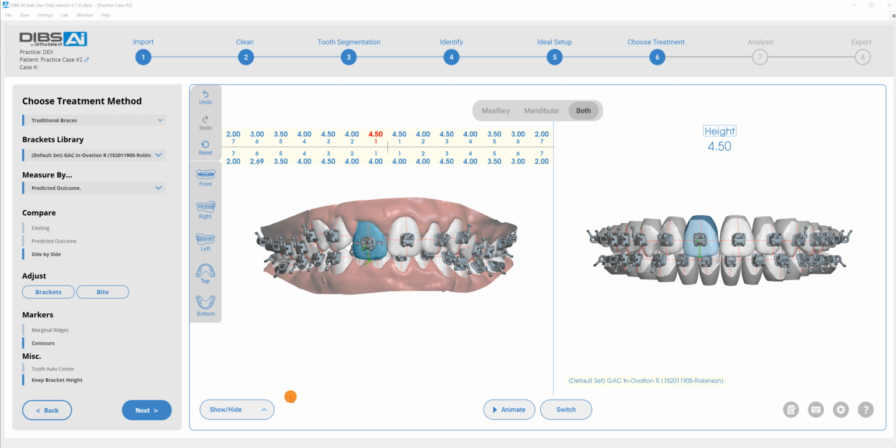One of the questions we receive frequently from doctors is really pushback on the heights that are displayed within the software. We receive doubts that that's really the right number. Just by visually looking at a bracket, a doctor will say that's not the right height. And what we've learned is there's basically different angles at which you can measure the height. We've learned doctors like to do it in different ways.